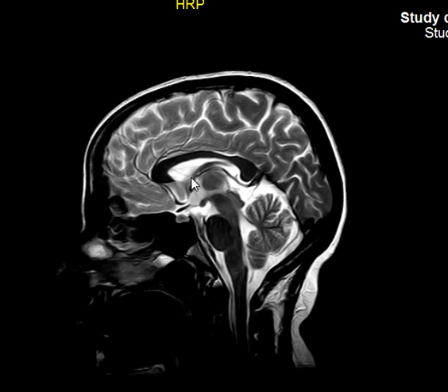And above is the third ventricle. And in between, the channel is what? The aqueduct of Sylvius that we saw in the axial images, if you remember. Okay? So, if you have hydrocephalus or dilated ventricles limited to the third and lateral ventricles, but the fourth ventricle is normal, then it means the aqueduct of Sylvius is obstructed somewhere, somehow. Well, if all of them are dilated, that means it's not the aqueduct, it's something else affecting all the ventricles.